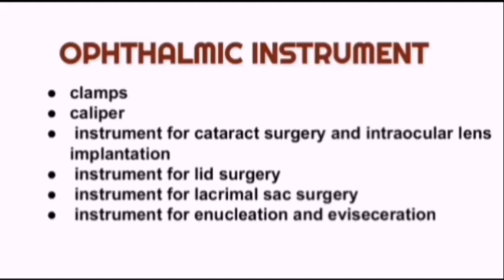Right? So if you know the instrument, name it before I explain it, right? And if you don't, here it is for you to learn. So let's begin with the first one that includes lid speculum.